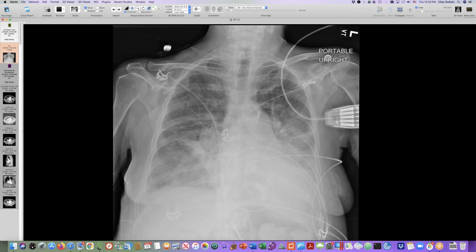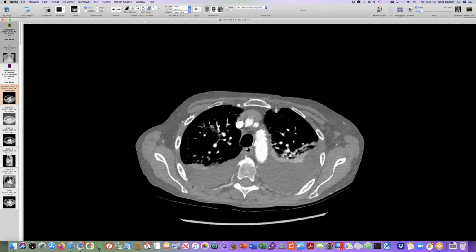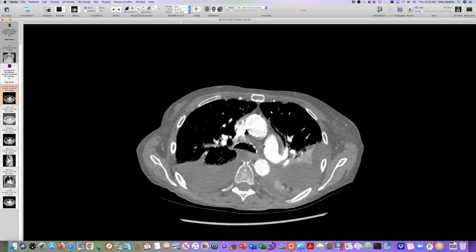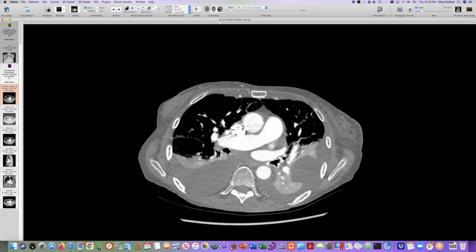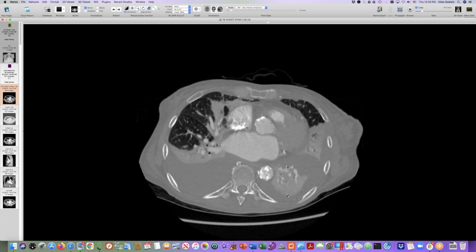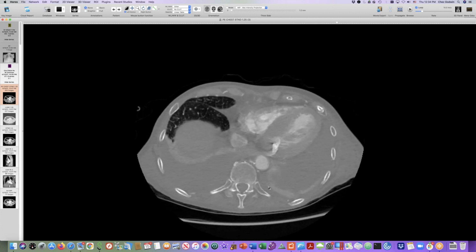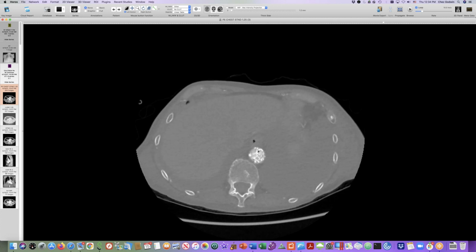And then I'd like to show you this woman who has a history of atrial fibrillation, heavy cigarette smoking, COPD, and a lot of lung consolidation. So this is her current radiograph, and it shows all of this consolidation in mid and lower lungs and bilateral pleural effusion, calcified aorta. And you can faintly see that there's some mitral annulus calcification back here, and then there's a more central calcification here and maybe down here in the abdomen too.